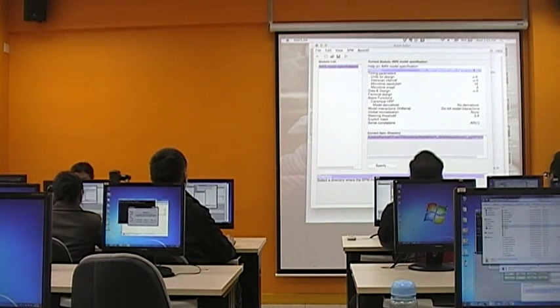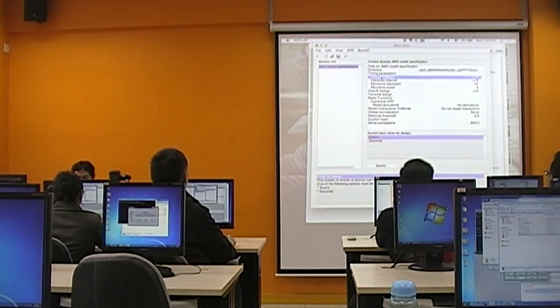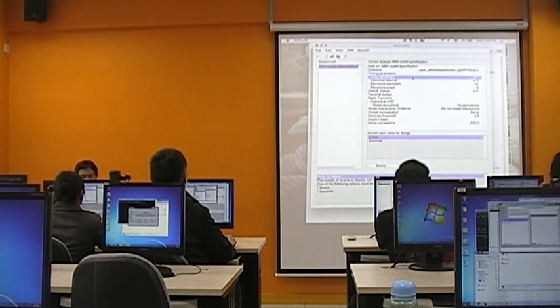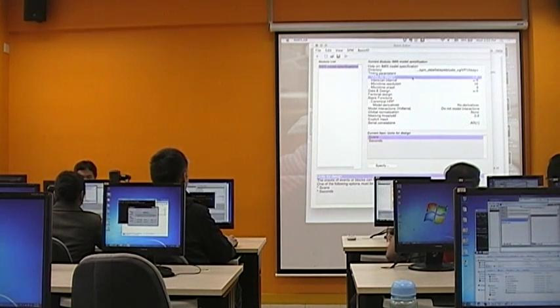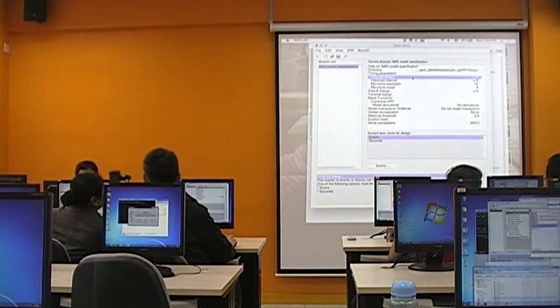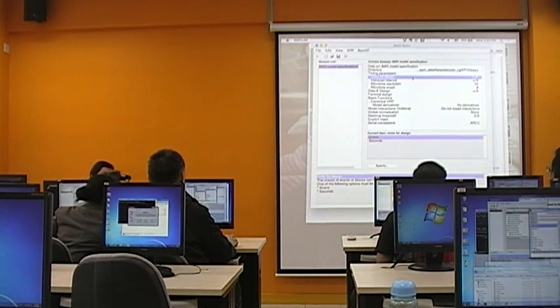And then it's time for you to put in some parameters. First of all, you will need to specify the unit of your design. Whether you want to count your time in terms of the number of scans, or in terms of the number of seconds that passed, it doesn't really matter a lot.